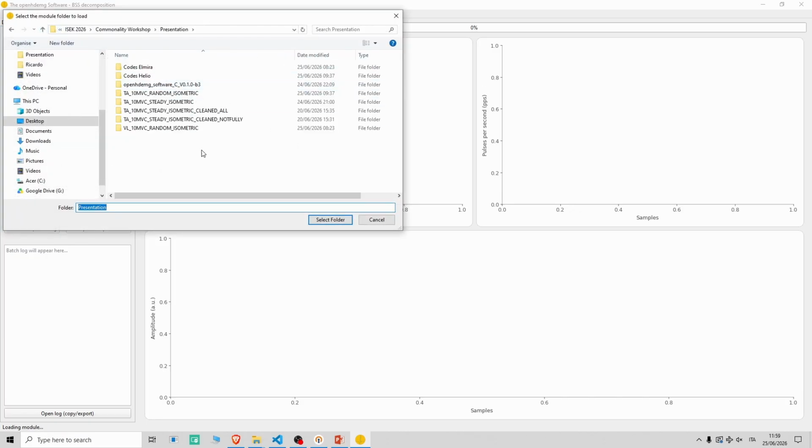This is the one that we will use now. That is a data format that we have created specifically for this new release that came from a long time of studying the necessities that we have in EMG, and it's a combination of binary files and a mapping file, which has been optimized to give you a lot of speed in the loading, saving, in the processing, and a lot of flexibility. It also has a checksum that you can use to verify the integrity of the files in case you decide to share it in repositories, for example.